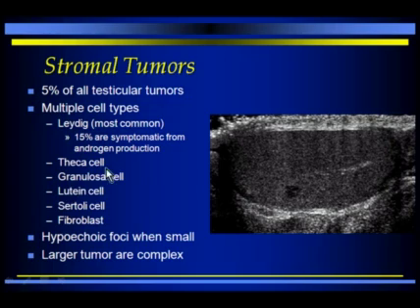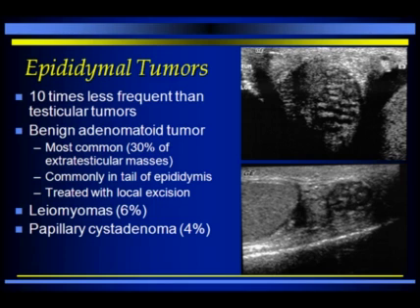So usually they're hypoechoic when they're small, just as seen here. The large tumors can be more complex in appearance, but it's in your differential diagnosis. You're not going to be able in general to distinguish these from seminoma.